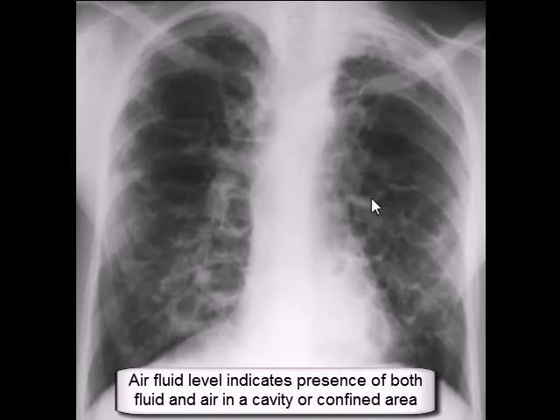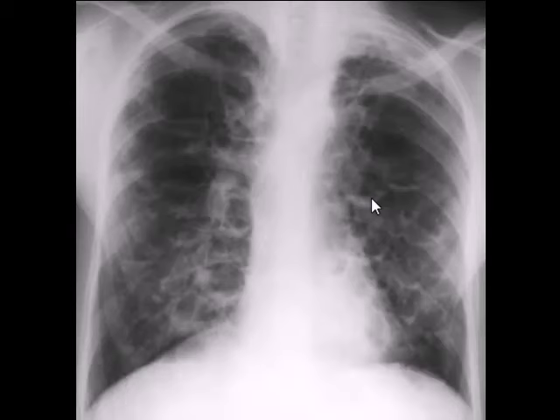In supine position, the fluid will still fall towards the gravity, means towards the back of the patient, and air will still rise up, but you will be looking at these cavities from top, so the fluid levels will not be visible to you.